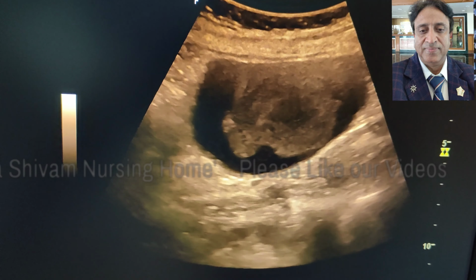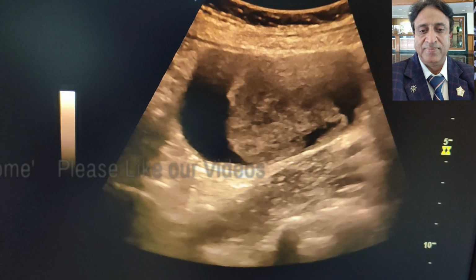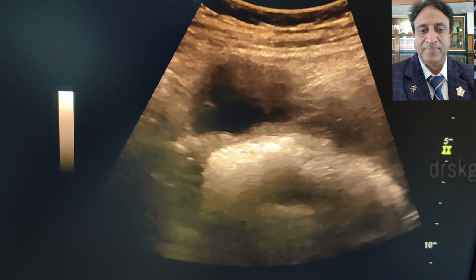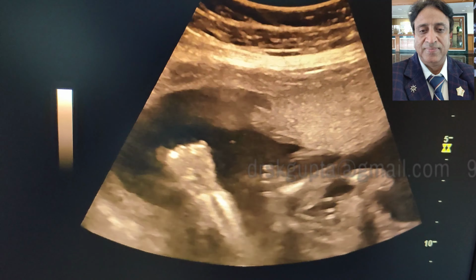It is possible that the fetal demise occurred early in the pregnancy because of the compromised supplies, or because the rudimentary horn could not grow as per the requirement of the fetus.